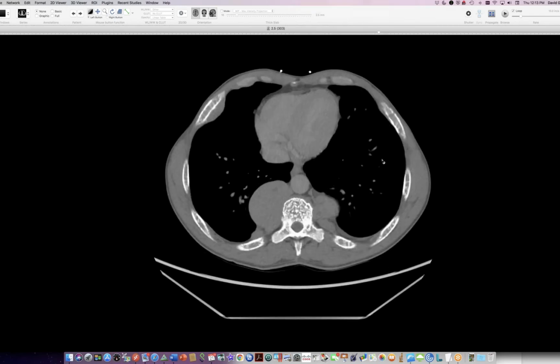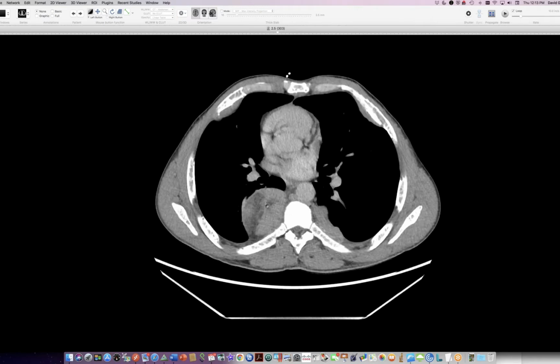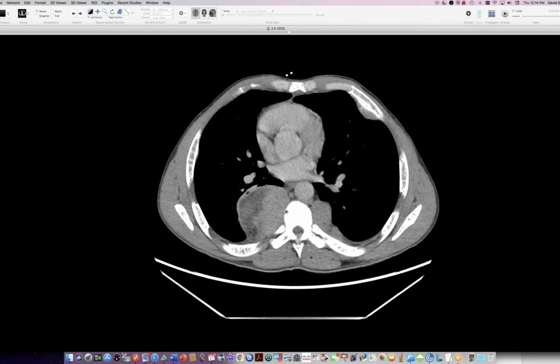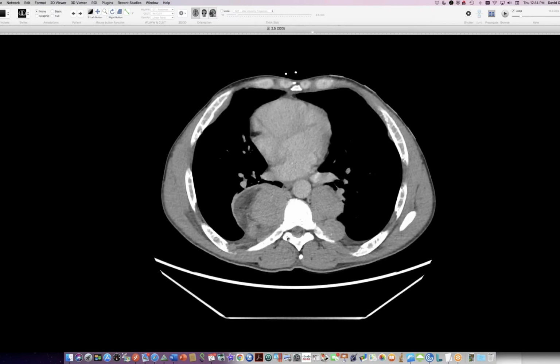So this is a slam dunk for extramedullary hematopoiesis. The presence of fat in some of these lesions was thought to be atypical, but actually we've seen that before. I've seen a case in which the person had dramatic paraspinal masses like this, and when the person was given adequate hemoglobin replacement, got enough transfusions on board, the extramedullary hematopoiesis, the dense component, regressed, and we were left with a lot more fat. So these lesions can be replaced entirely with fat if the marrow elements are not being hyperstimulated. So this is almost certainly beta thalassemia.